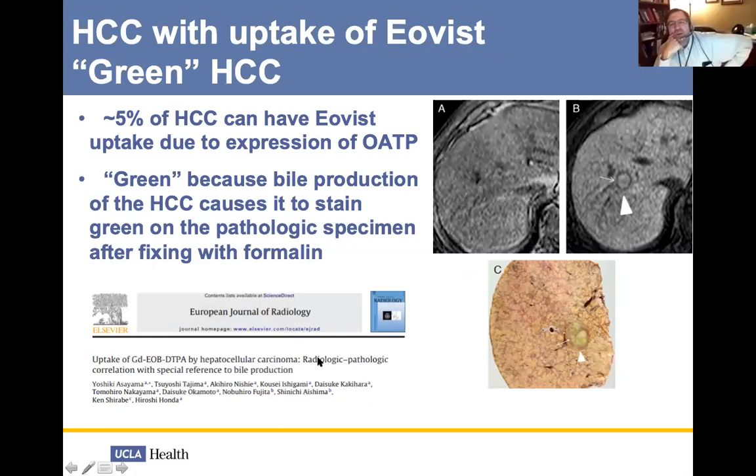Did you compare it to any reported case reports of so-called atypical FNHs? I guess that was your backup differential. Whenever I see hepatobiliary phase uptake, I know there are some FNHs out there that can look kind of strange, and I wonder if mine looks like one of those. Then I start looking for case reports. There are some case reports of FNHs, because they end up going to resection also, that can look kind of weird.